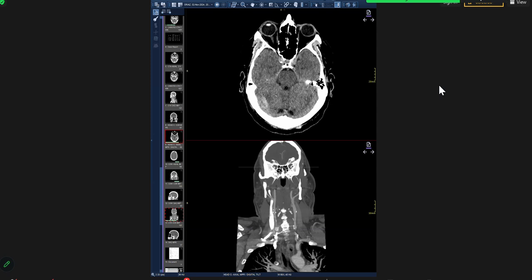If you see that low attenuation of the thalami, there are three main causes you need to think about: dural sinus thrombosis; artery of Percheron infarction, in which there's a single artery supplying both thalami, which you can Google and I've reported one case; and the third would be thalamic gliomas. You can also have bilateral thalamic gliomas, and I have seen one case of that as well. So these would be the causes.